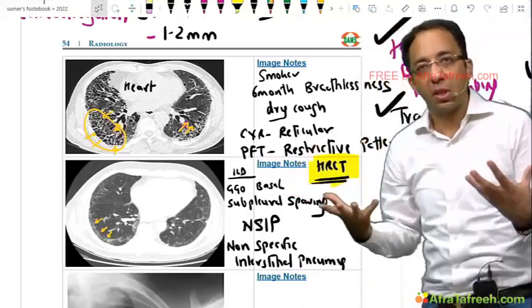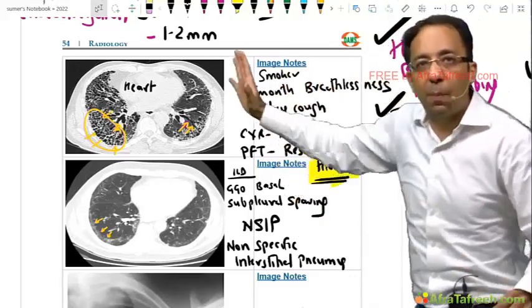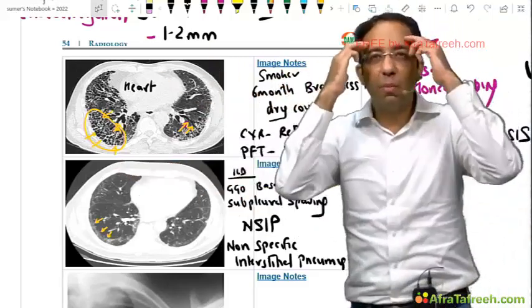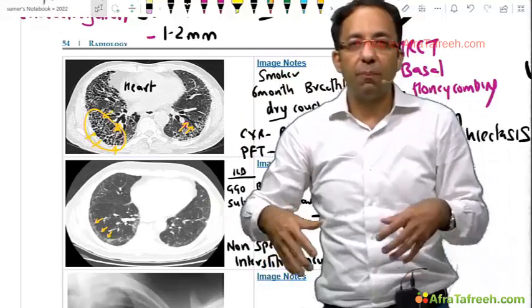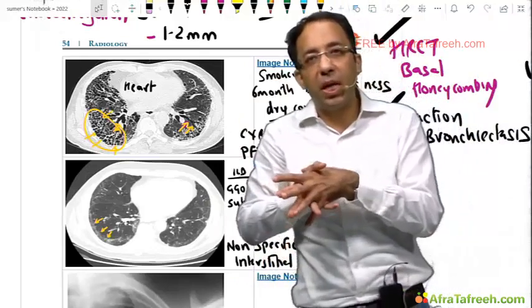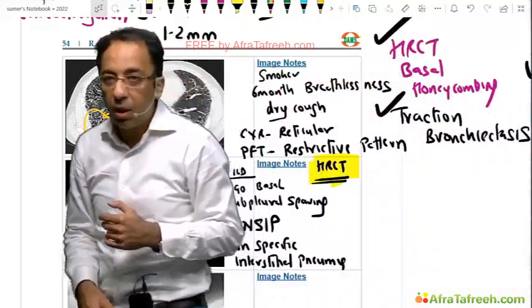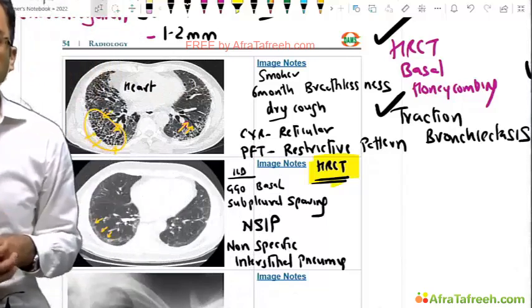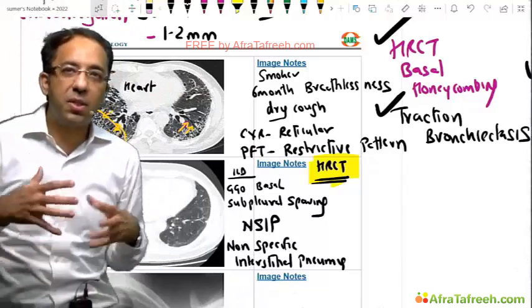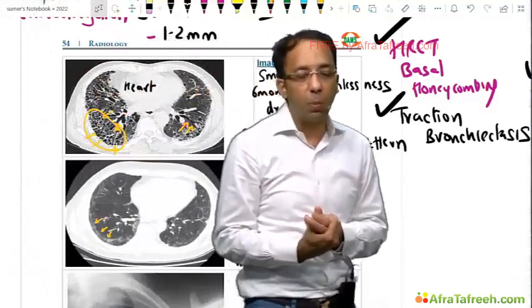These are patterns of interstitial lung disease. These are not causes, right. We don't know what the cause is, but because of that cause, this has now happened. Just like in the liver, think of cirrhosis. It could be multiple causes, but the end result is cirrhosis or fibrotic end stage liver disease. Here, what is happening in the lungs is UIP, usual interstitial pneumonia. It is the end stage of an interstitial process that is happening, which tells you that now there is poor prognosis.